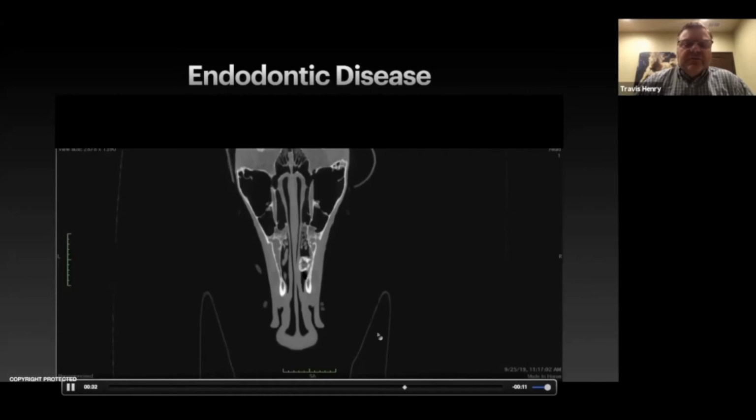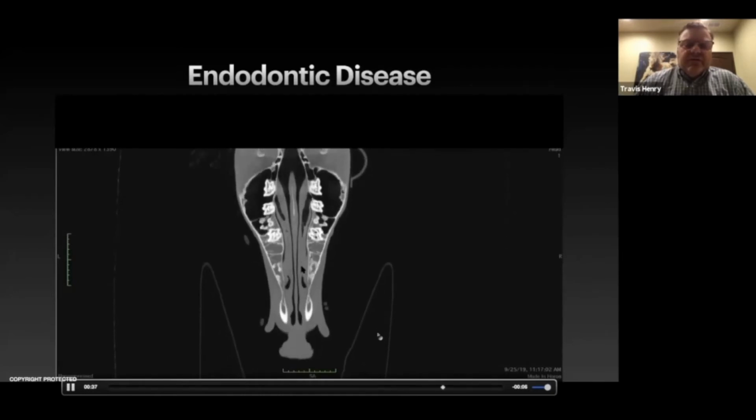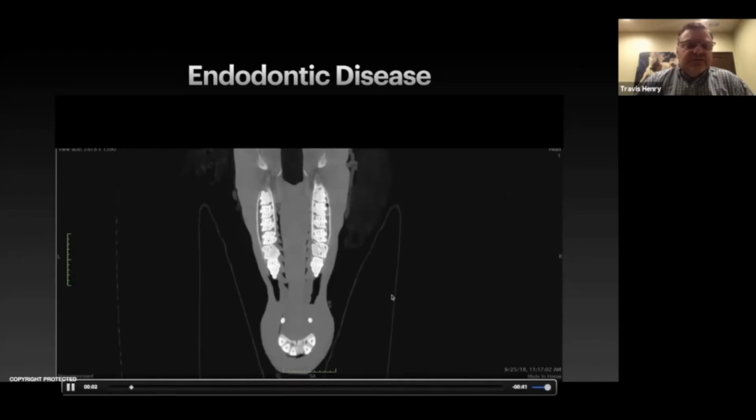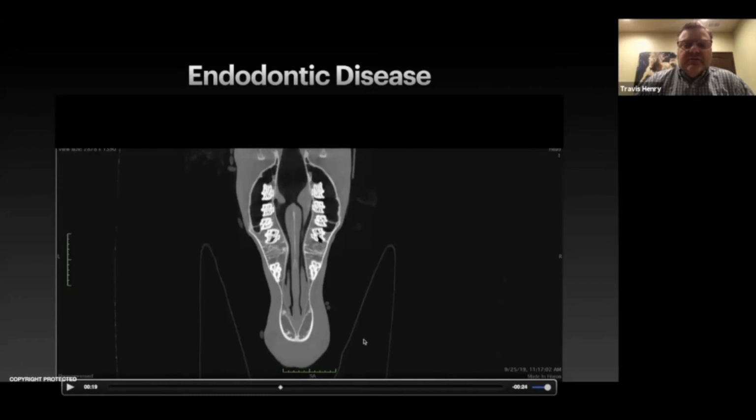So what was really going on with this patient was there was a separate center of dental material, and you can see how the roots are ending here of the 6 and the 7. And the other thing I want you to notice, if we just jump forward here a little bit, is the infundibula of these teeth as well, how big and gas-filled they are.